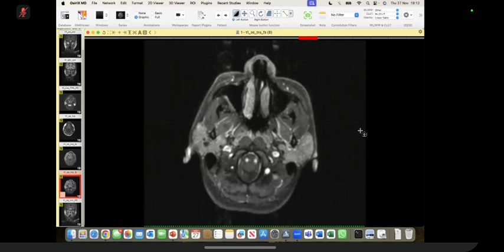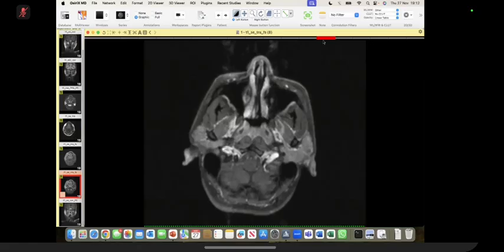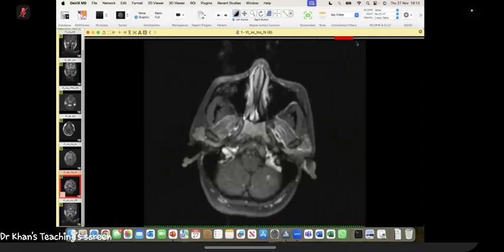So what are the other findings which will help you make a final consolidated diagnosis, which you have to see in this case? Sir, I cannot see any significant lymphadenopathy. So that signifies that this is less likely to be any malignant etiology. Other than that, sir, there is no mass effect or any invasion of the adjacent neck vessels. So this is likely a benign etiology that is involving the parotid glands as well as the submandibular glands in this case.